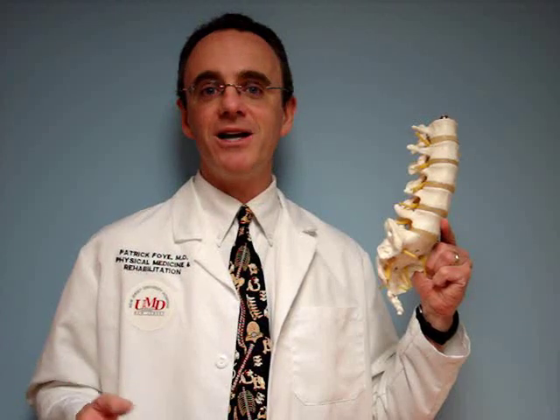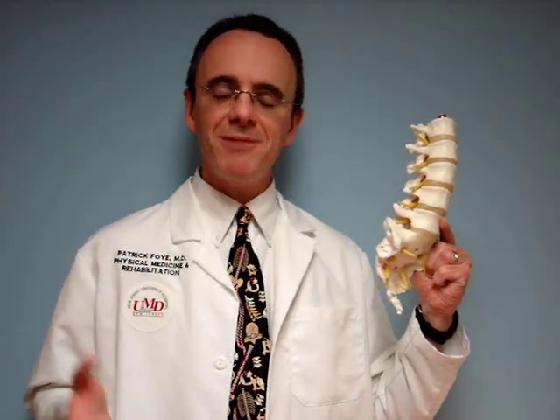This video is on how to tell if your x-rays included the coccyx or tailbone. This is of course very important if you have tailbone pain and if you have x-rays done for that, or if you're going to have x-rays done for that, you want to make sure that the x-rays actually include the tailbone.